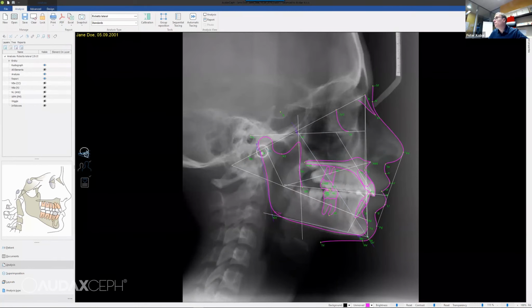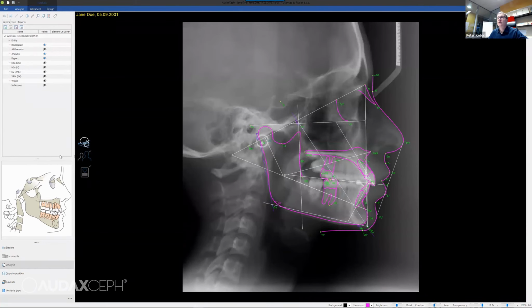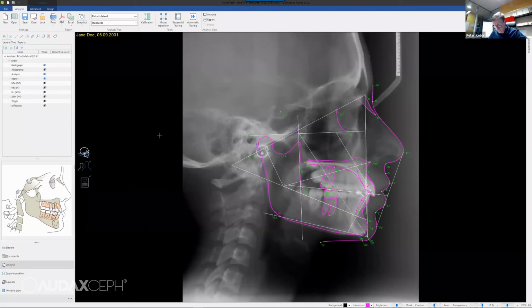Ribbon can be made small here as well, so something like this, and with this software it looks really easy. Functionalities or tools are available by clicking here, and the ribbon pops up again, but I prefer this kind of user interface.